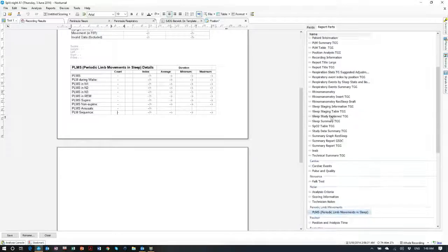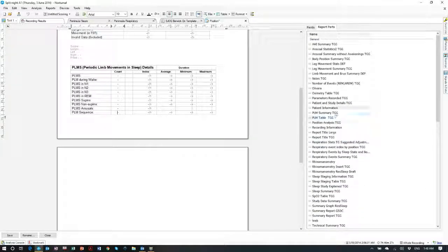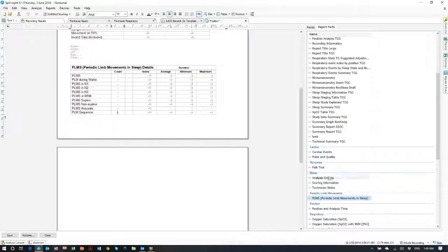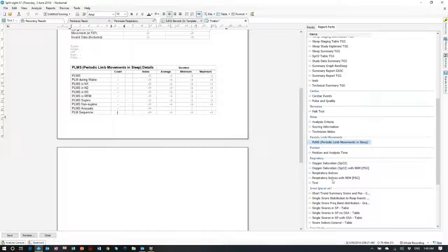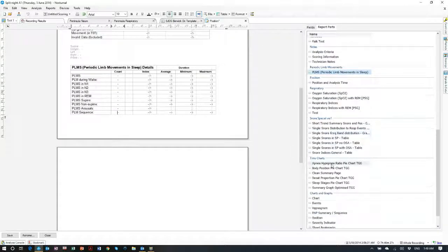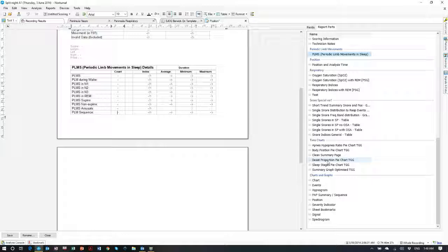Let's try that, shall we? General. Well, you get the picture. I can't find the one I'm looking for at the moment. Patient. There's notes. There's all kinds of charts and stuff. I think it's just called Tim's charts, because I can configure whatever categories that I want as well.